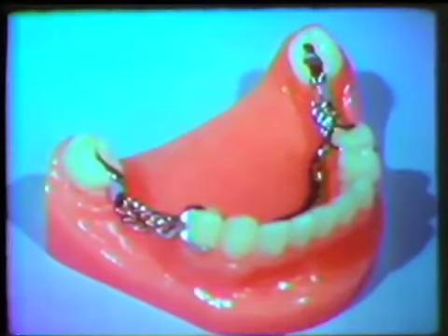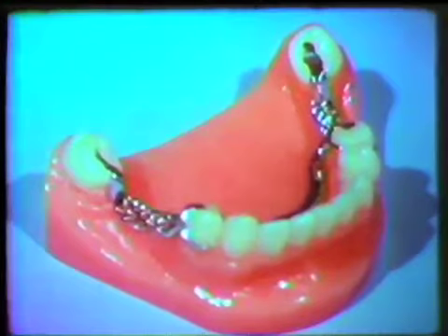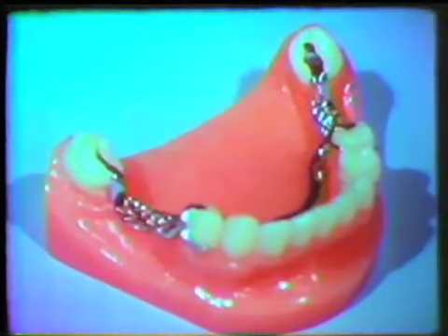The minor connector on the molar abutment is in intimate contact with the mesial surface. Consequently, the molar rest cannot be lifted because the minor connector is locked into the undercut. The framework can only be removed by first dislodging the clasps on the premolars.